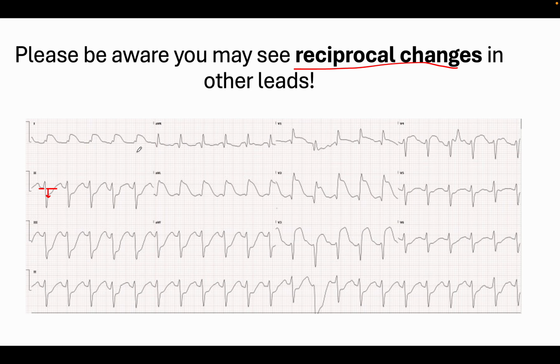No, this is showing a STEMI with reciprocal changes in the inferior leads. And reciprocal changes are basically changes in leads where the infarct isn't happening. However, it interprets the electrical activity from other myocardial regions by showing basically the opposite pattern. In this case, there's a true infarct in the lateral leads and the anterior leads. However, the inferior leads are basically processing that injury as ST depression, because they don't directly look at that myocardial territory, if that makes sense.